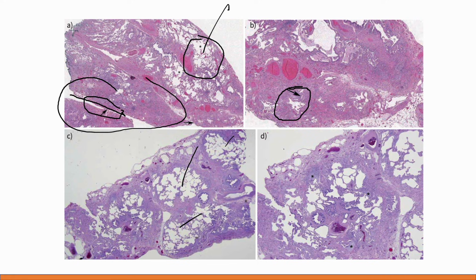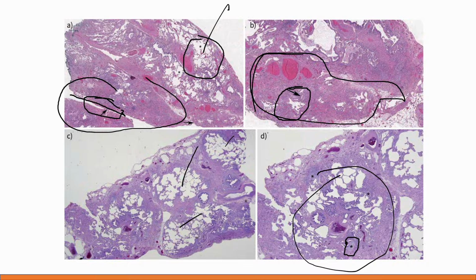And here, what we can see are the fibroblastic foci, which are visible on the higher magnification view. So, there is some patchy fibrosis, there are fibroblastic foci, but the extent of the honeycombing and the scarring is not there. So, here also you can appreciate the extent of the scarring and involvement versus the extent of the involvement here.